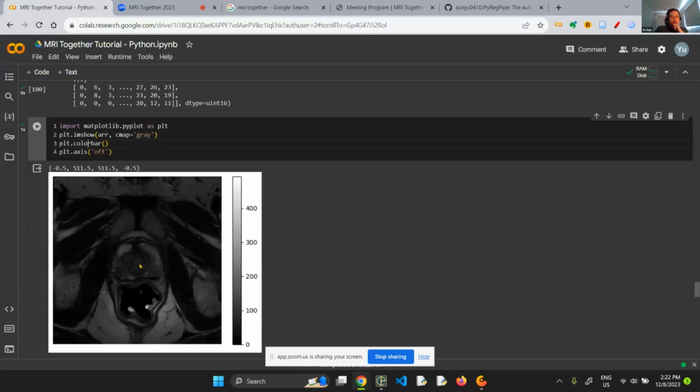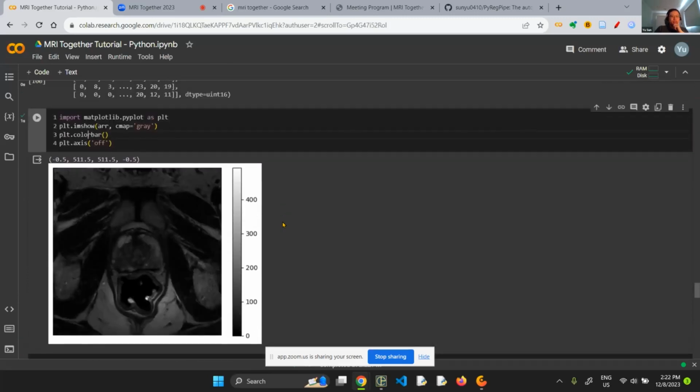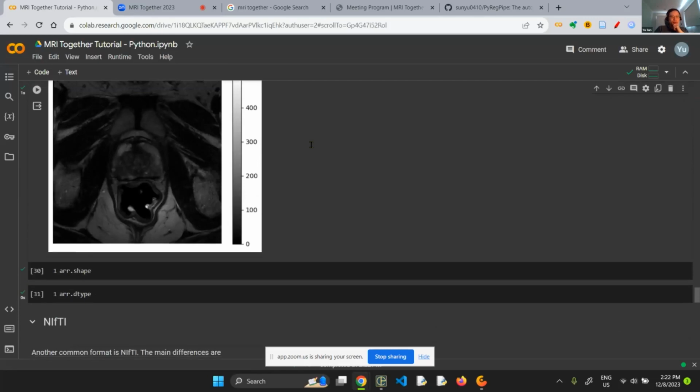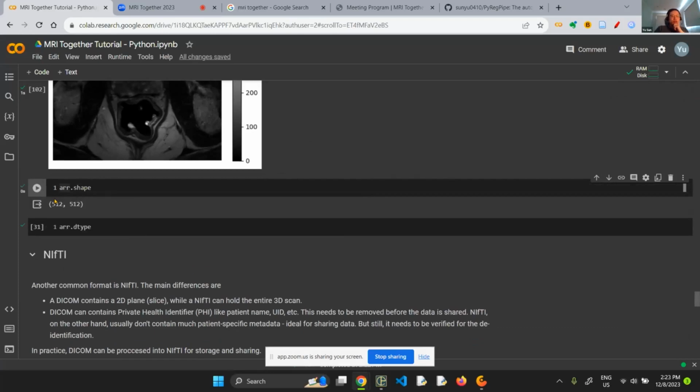This is very rudimentary, and you can get nicer prints using other libraries or by customizing matplotlib. Here I just show you the very basic way to get some information out and verify that it's the right thing you get. Since it's a NumPy array, everything you know about NumPy will be useful here: how you flip the data, how you get to certain rows, indexing, slicing.